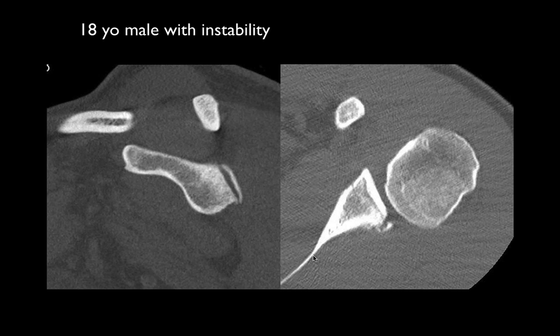So what are you seeing on the CT? On the CT, we see a small bone fragment arising from the posterior glenoid, likely a periosteal sleeve avulsion, and there's also some retroversion of the glenoid itself. It may have contributed to this. So this calcification here is probably more calcification of the periosteal attachment and the labrum. What we see is marked flattening of the posterior glenoid, which should be rounded. And this patient has probably had a posterior dislocation event, and as you said, a fracture of the glenoid rim.